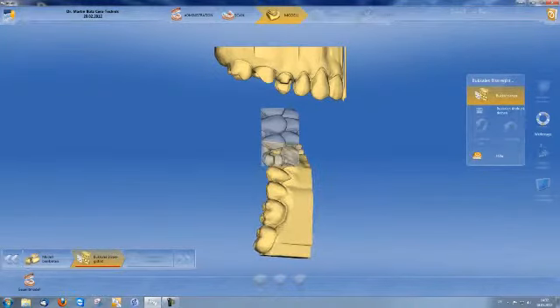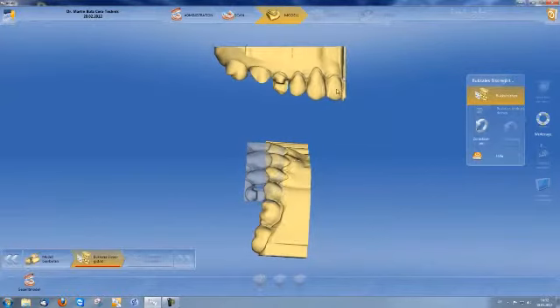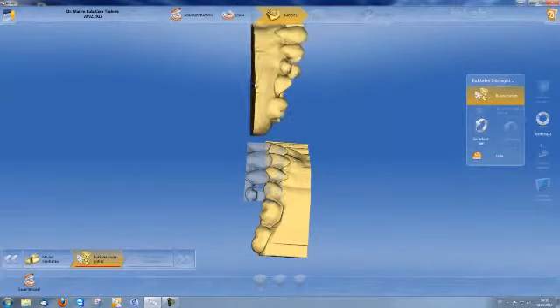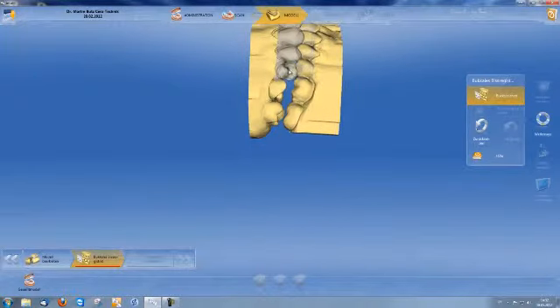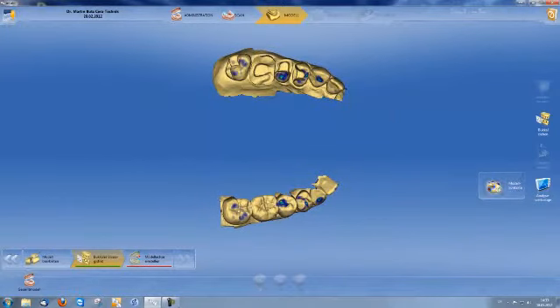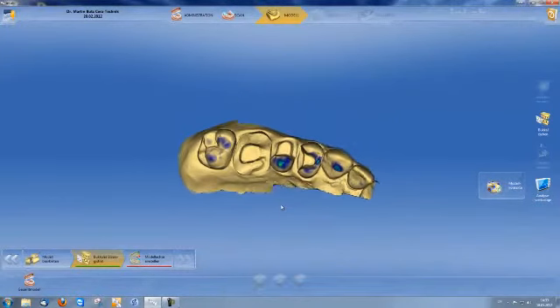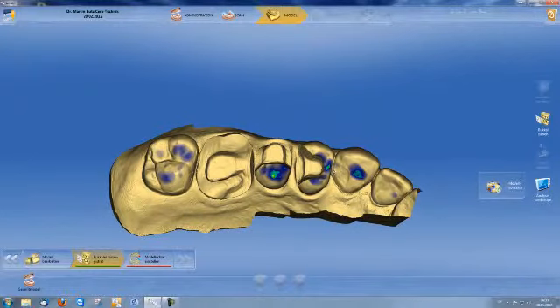I move my lower jaw, drag and drop, buccal scan on the lower jaw. The software calculates this automatically. I then move the upper jaw into the correct position and using drag and drop also reposition the buccal scan. Following registration, I can display my model contacts on the model with Analysis Tools, Model Contacts, and could also check in the articulator whether these contacts correspond with my 3D model.